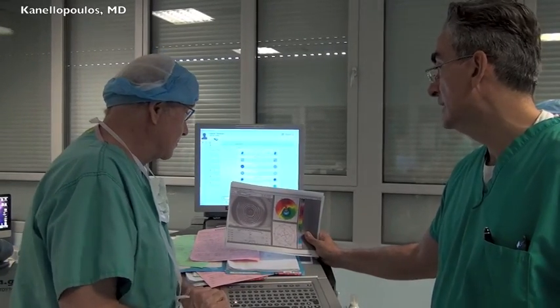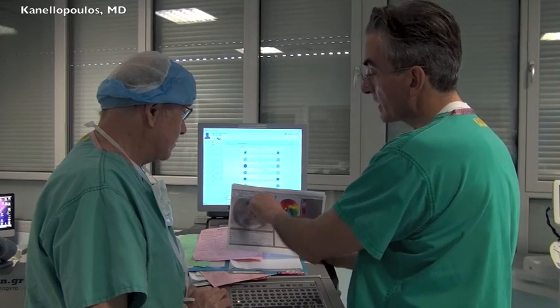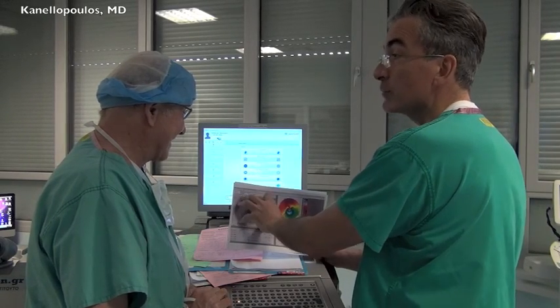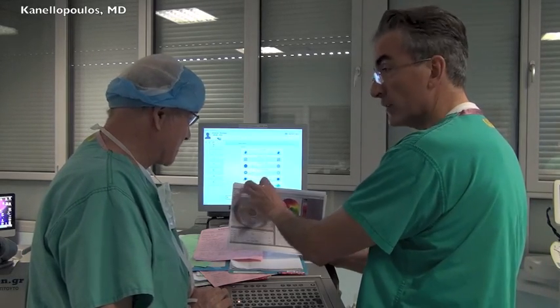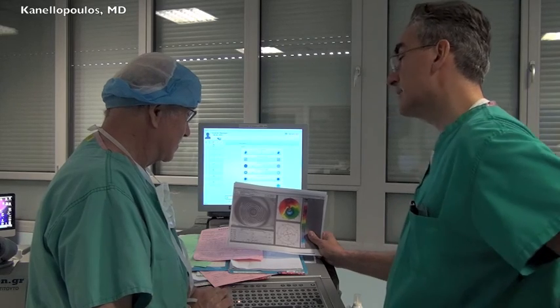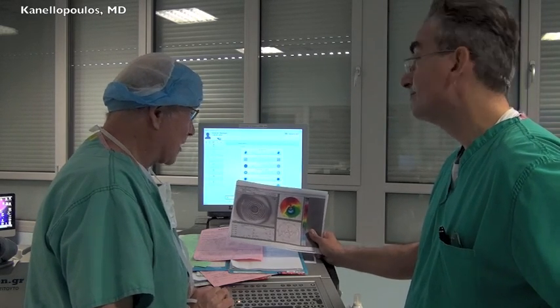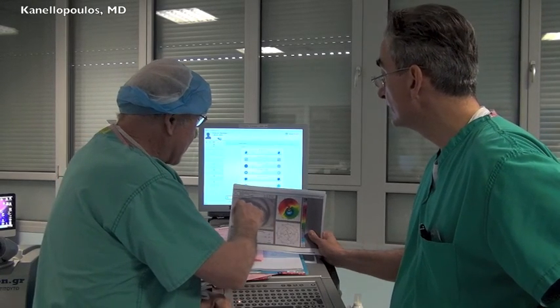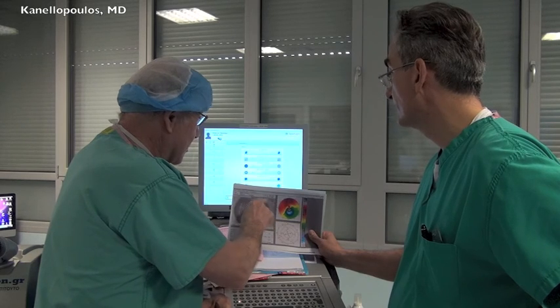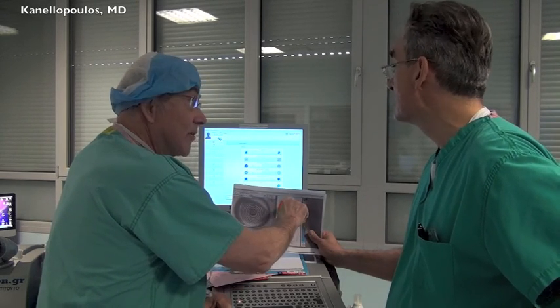Very excellent point. And this, 20 years ago, we would probably attempt an astigmatic keratotomy here based purely on the placido disc image, and then titrate it according to what the image would be in sequential mapping. Good. Here's a question, John. You notice here that the lid is covering this upper area, and yet we have readings from the upper area.